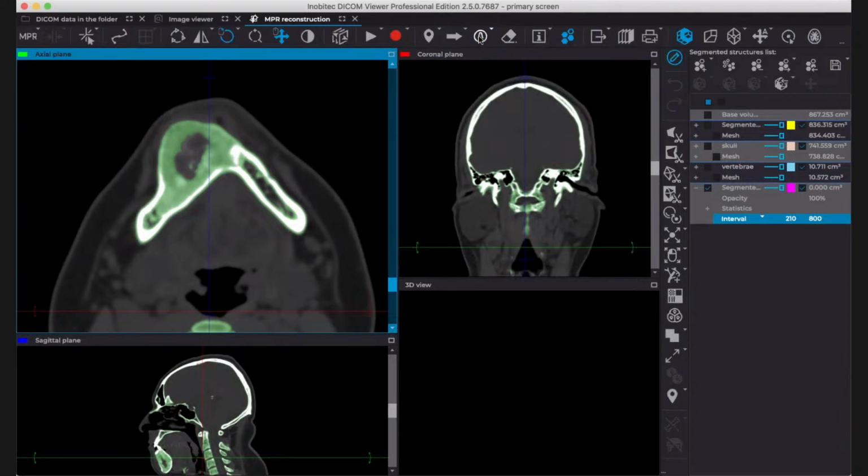Click over it and it disappears. And we can always use this tool as we were using earlier. So you see, I can just make it appear or disappear, or make it bigger, or select more part of my model. Okay, I think I will work with this window.